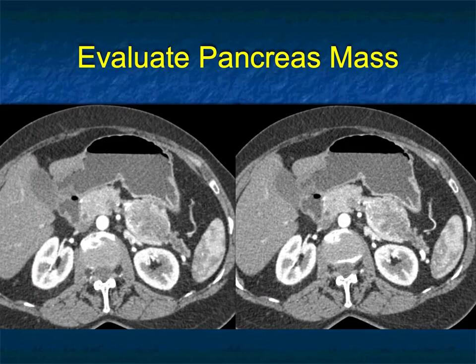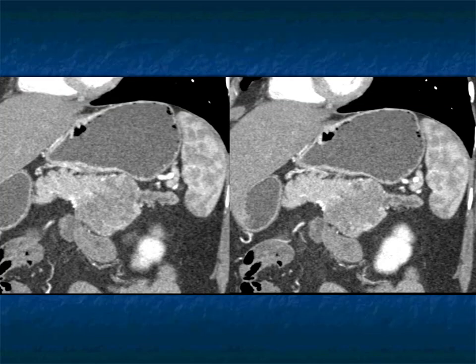What about this case now? Pancreas. Mass in the junction of body and tail of pancreas, dilated pancreatic duct. So the first thing you want to jump on is pancreatic adenocarcinoma. But I'm going to say to you, that's not the answer. If you look more carefully at this lesion, particularly on the coronal views, yes, there's duct dilatation. Yes, that's atrophy at the tail. And yes, that worries me.